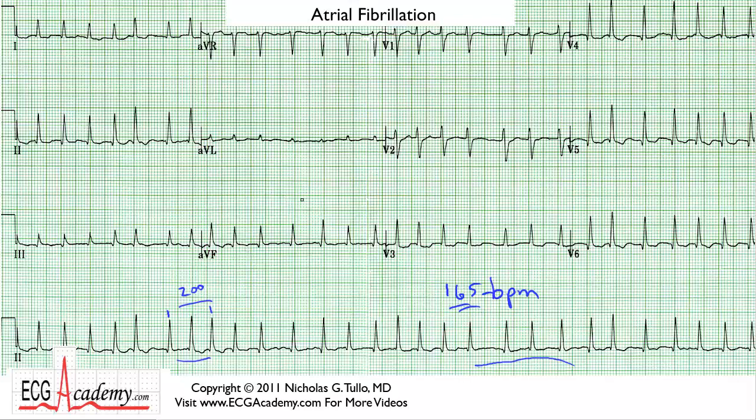Trying to accurately diagnose this as atrial fibrillation now is a bit of a challenge because you're really obligated to rule out other things. Things like multifocal atrial tachycardia or atrial flutter with variable conduction. And so it's important that you look in front of every single QRS complex, especially the ones with the longer R to R intervals, to see if you can get a sense of whether there is any kind of a consistent P wave in front of each beat or whether there's a consistent flutter wave that's marching through the entire strip.